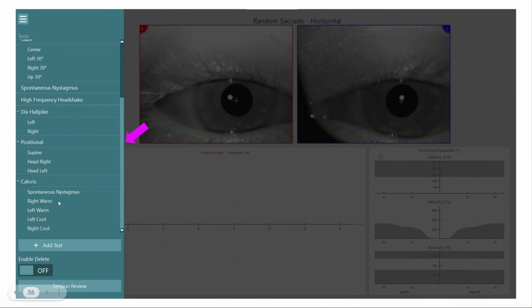And you've got all those, and you can jump around if you want. So you can go click on whichever one you want to do next. If you're trying to do something out of order for whatever reason, you can certainly do that, and it'll jump straight to that test. Otherwise, the test just kind of runs in the order that it's listed here.